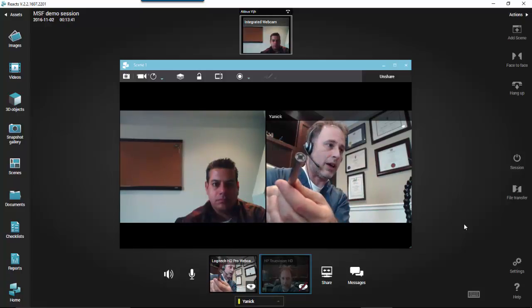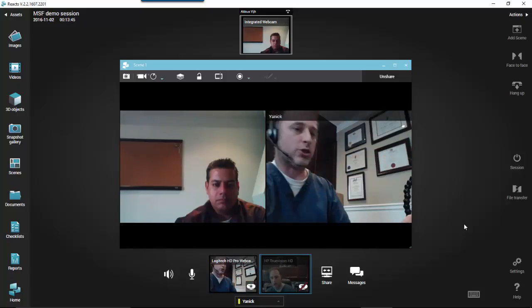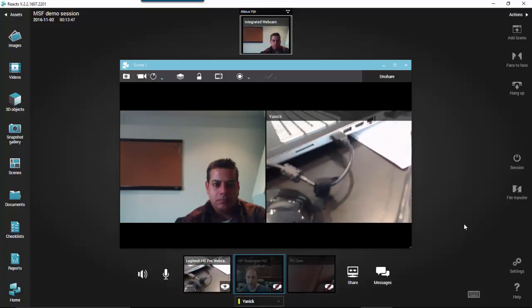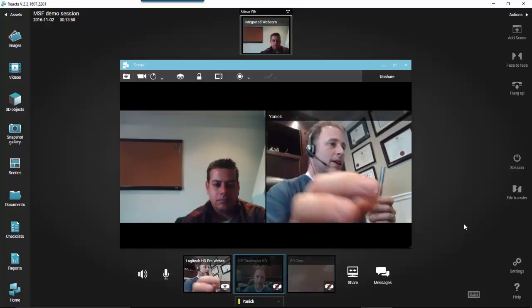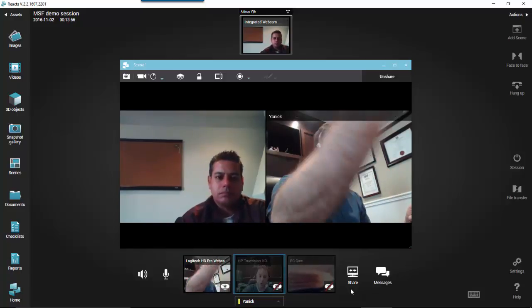So then here you'll see I'm going to connect another camera. This camera is like a pen camera. Let's say for skin lesions or things like this. I'm just connecting it, just USB connected in my computer port. And you have seen it now. It appeared at the bottom in my video feeds, but it's muted. So it's not using bandwidth.